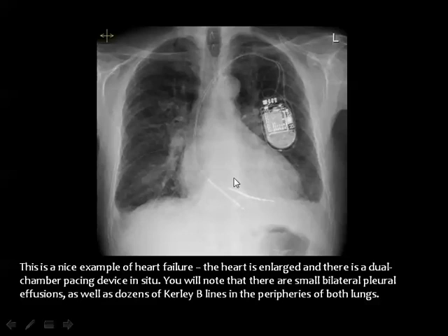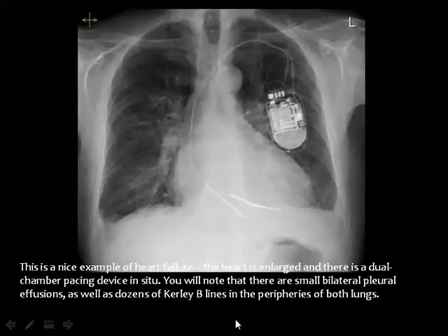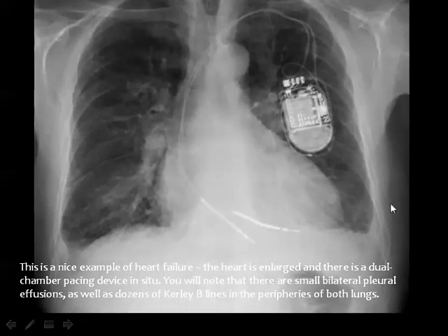If the heart is enlarged and you got like this pacemaker and you got left ventricular dilatation, look carefully at the costophrenic angle for these linear opacities at the costophrenic angle, which represents the Kerley B line. You know, Kerley B line. Then I will magnify this so that you can see what I mean by the Kerley B line, and you got some more longer opacities near the hilum, and these are the Kerley A line.